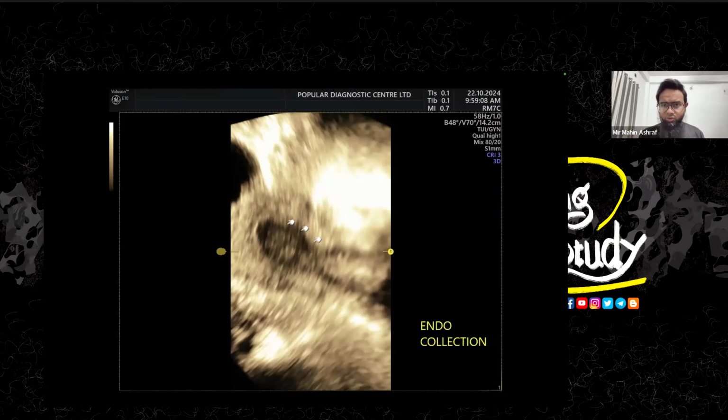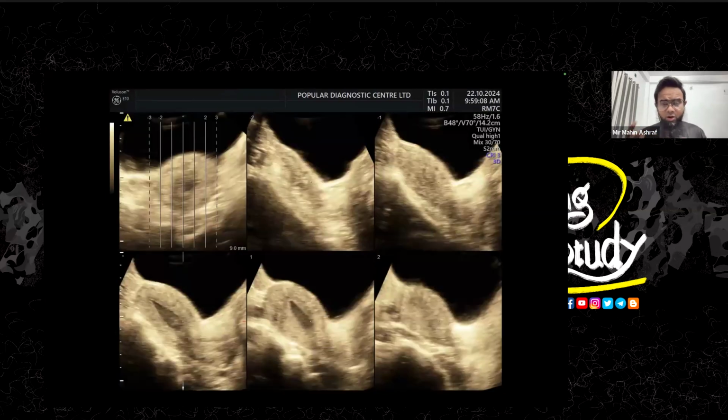In this type of situation, we think of two important things. The first one: in our country, tuberculosis is quite common, so we think about tuberculosis. We need to check the swab from this part, this collection, and then from the swab test we would go for tuberculosis exclusion. Another one: this is an endometrium with chronic features, as the patient is giving a chronic history, but you can see a good amount of vascularity.